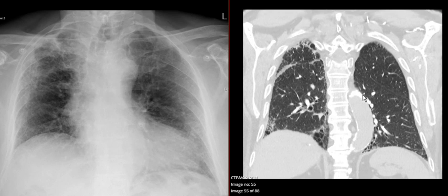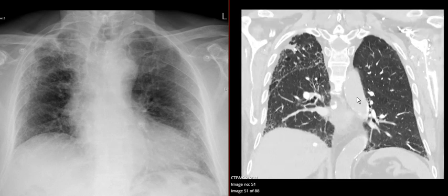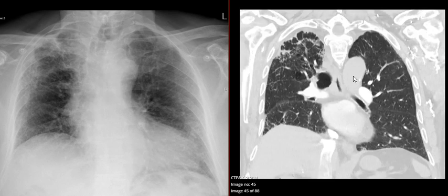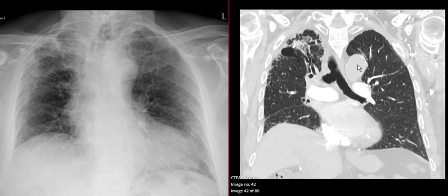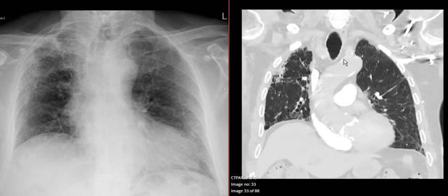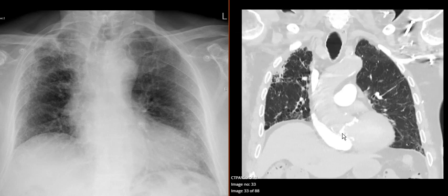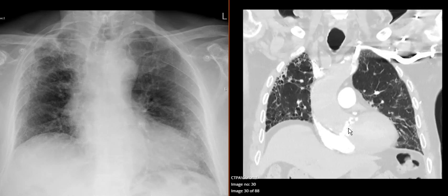And the walls of the aorta are very white and very calcified. So he's got hardening of his arteries, like calcium is literally the hardening of the arteries. This is the top of the arch of the aorta, this little aortic knuckle there. You can see calcification in a ring shape, which is slightly visible on here. And then calcification of the ascending aorta too. And here is the aortic valve, which also looks quite calcified. So that's what that is, calcification of the aortic valve.